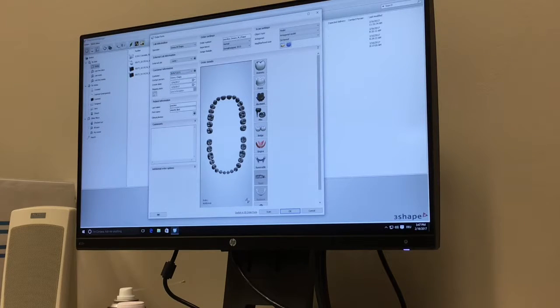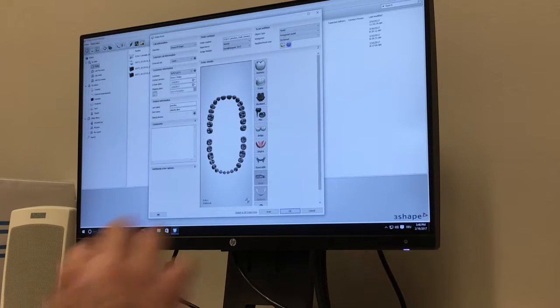This is a practice case, Atlantis abutment. I have been doing this with our cases now. I put the date, 02/16/17. I put the patient's name. In this case, it's going to be practice. So underscore practice, and then the doctor's name. Let's see, I'm going to put Dr. Cook. And then the tech, or whoever it is that is scanning.